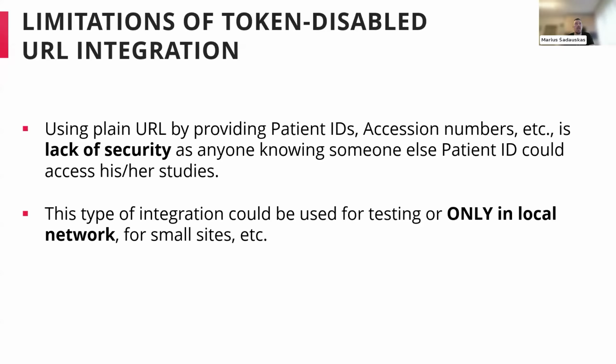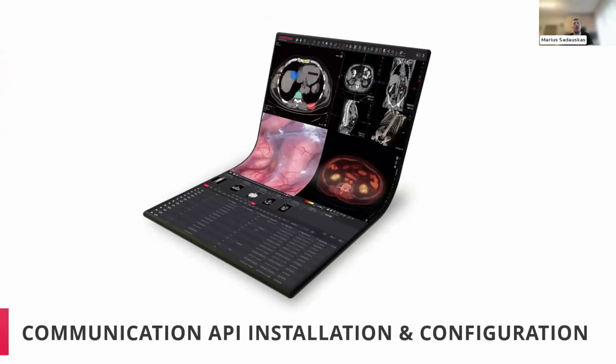So token disabled URL integration could only be used for testing, as I will be doing now, or only in very small, very isolated sites in the local network where there would be no internet access and no huge workload.